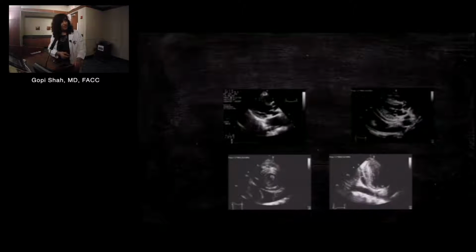This is your normal parasternal view, a little bit off axis perhaps, but you can see here this pericardium as a bright echogenic area. You see this echolucent area, but it extends beyond the descending thoracic aorta, and it perhaps may represent a pleural effusion, which is better seen in this view here. You can see that the pericardial effusion tracks the cardiac silhouette and ends before the descending thoracic aorta. This is a concomitant pleural effusion that is also present here.